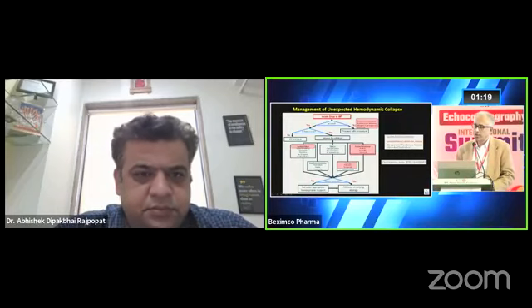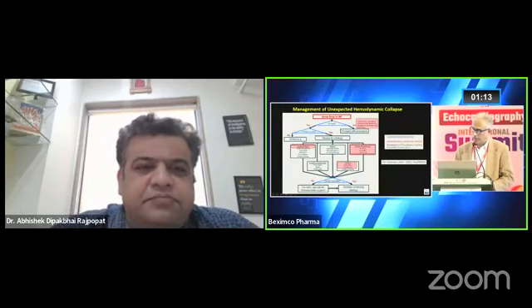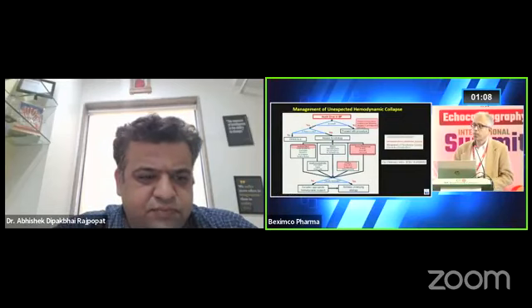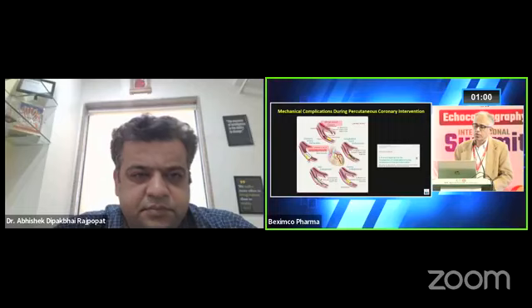And also look at any acute MR which has worsened, and also look at the LV function. And again, it is going to be the tamponade, the pericardial effusion that should be looked into. So these are quick points for when there is a drop in BP, and this is where echo's contribution can happen. This is a picture which sums up what complications can happen and how echo can help. So this will be the abrupt vessel closure and then the coronary artery perforation.